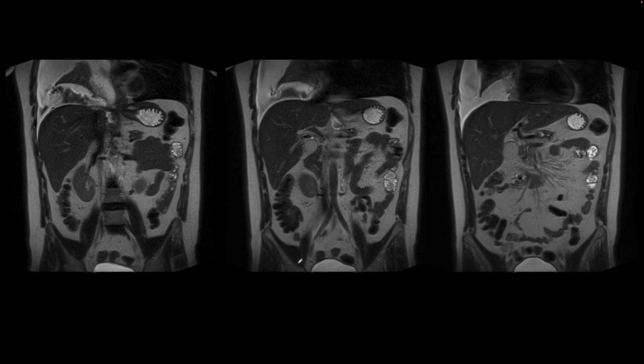This is our next patient. They presented with a complication of acute pancreatitis where these multiple coronal images from their MRI of the abdomen in T2 weighted sequence show a development of a fistulous connection through the diaphragm between the pancreas and the pleural space. So they have a pleural effusion, which is seen here, here, and here.